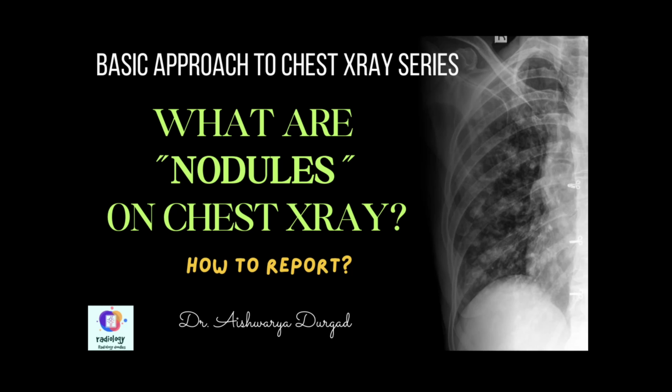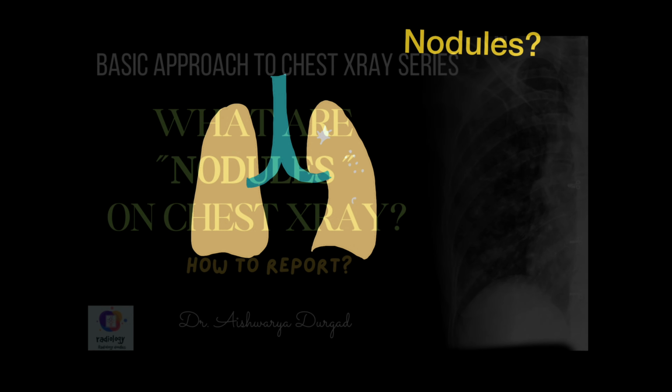In this basic approach to chest X-ray series, we'll see what nodules are on a chest X-ray and how to report them.